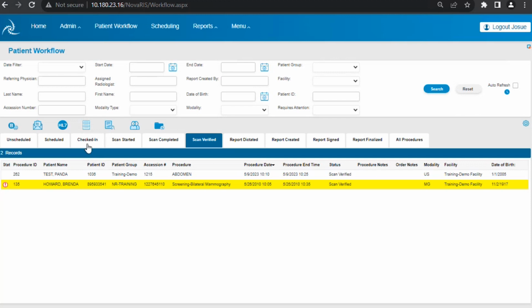Then we have the other one, the arrived. The arrived is mainly to know exactly which patients are on site, but are not ready to be called in yet. So that is very linked together with the screen option. The screen is where you have to prepare them, either at home or before coming in.